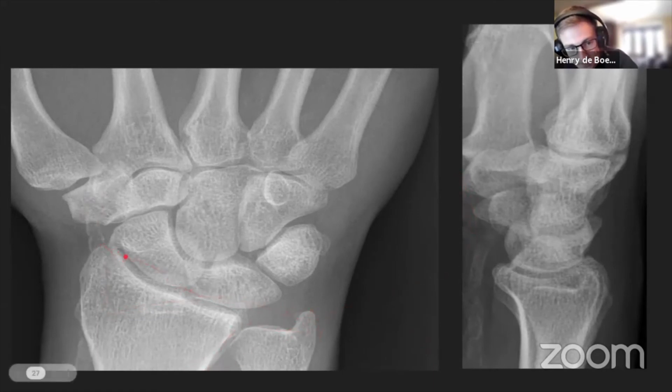Tracing the bones, this is catching my eye. I actually can't remember the answer, so we're looking at this fresh together. But this doesn't look normal. I think there's a step there. But the joint spaces themselves otherwise look okay, and the rest of the bones look okay. On the lateral, alignment looks okay. Obviously we thought the scaphoid looked not right, so paying close attention to the scaphoid.